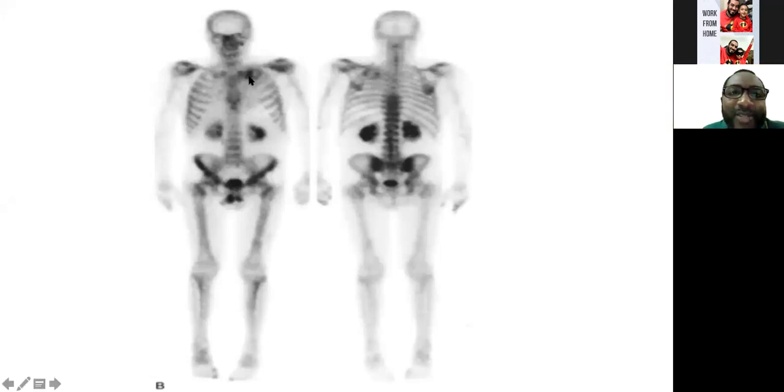When you have an intense uptake in the anterior that you see it on the posterior, all right? So it's a reflection of this image that you are seeing on this. It's called the shine through phenomenon. So this is not a secondary lesion. It's the same lesion that you are seeing. I'm very happy that you noted the kidney. You can see that this kidney has intense uptake. It means that there's obstruction.